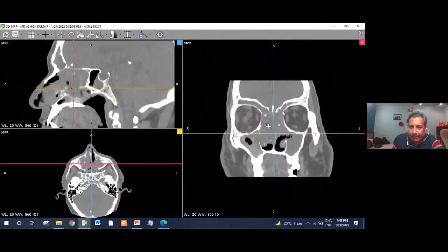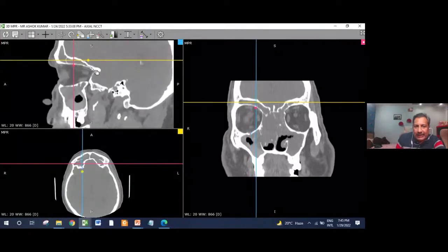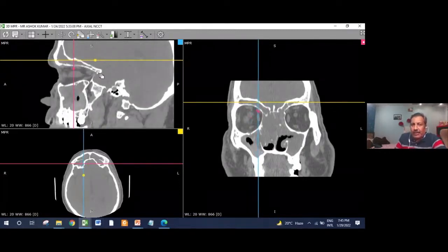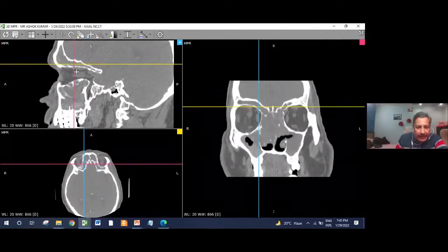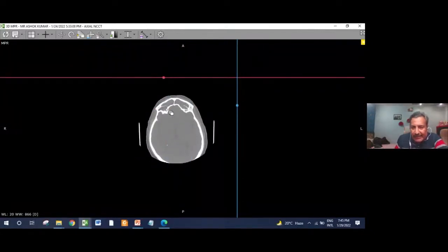Now see, I'm placing into this supraorbit. See this, right from the orbit anterior to posteriorly, all the way along almost the entire orbit, the supraorbital cell is. Your frontal sinus ends anteriorly, and this supraorbital cell is running all the way, crossing and almost completing the posterior level. Till that, the supraorbital pneumatization is continuing, and if you see in axial plane again, this posterior cell is supraorbital.